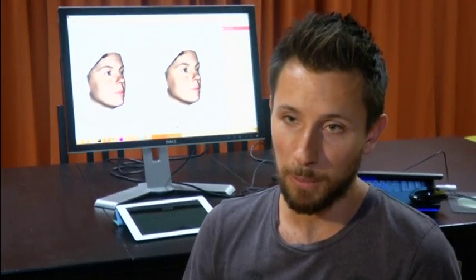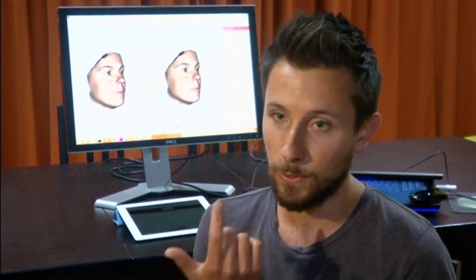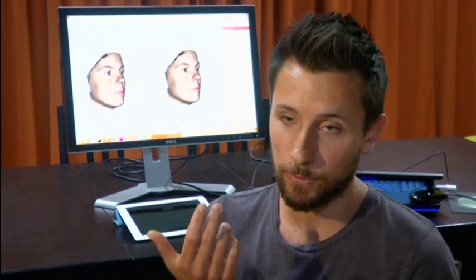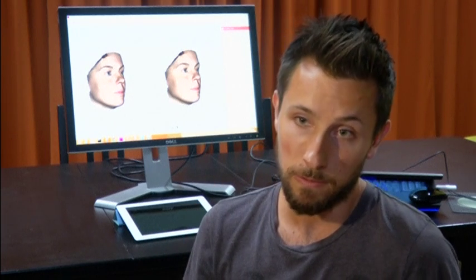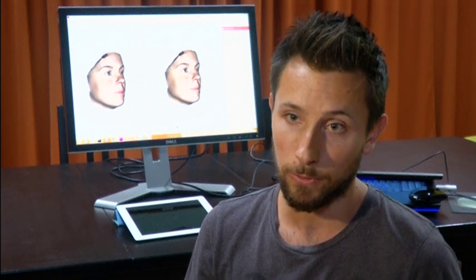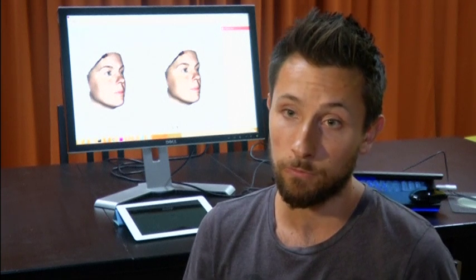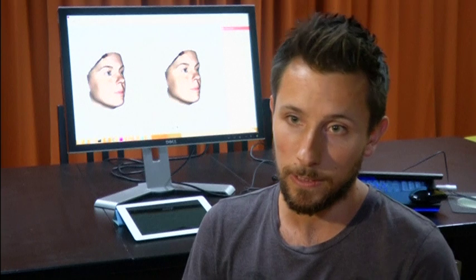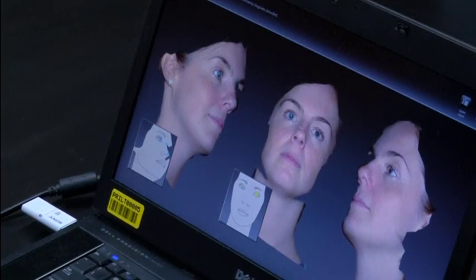So you have to pinpoint the landmarks on the face, and that's the 2 cheekbones and then the tip of the nose, if there is a nose, of course, and the corners of the eyes. And if you have those, the software can then generate, based on the data model it has, based on all the scans it did before, a nose that is really fitting for that face, that is realistic for that face, not necessarily the perfect nose, but fitting, that then can still be adjusted towards the needs of the patient.